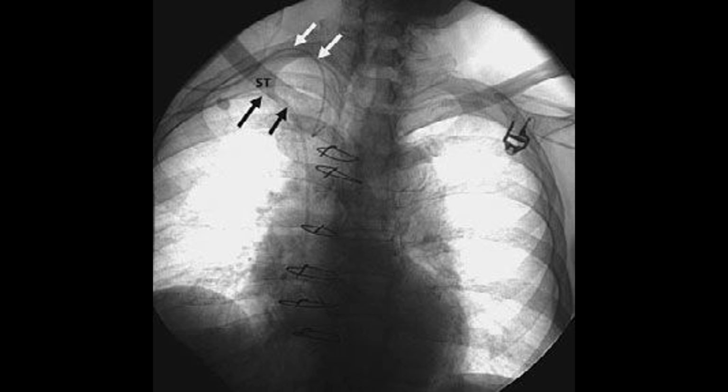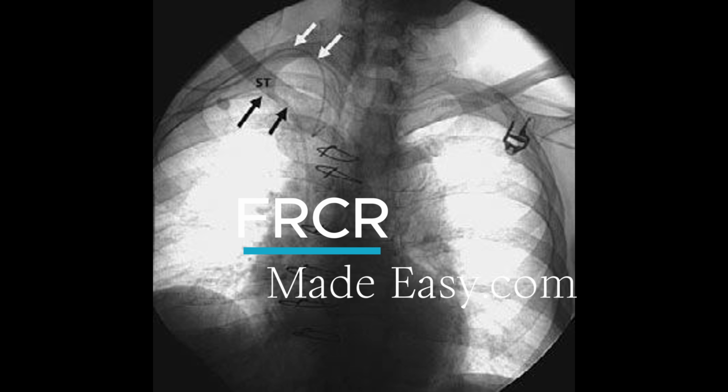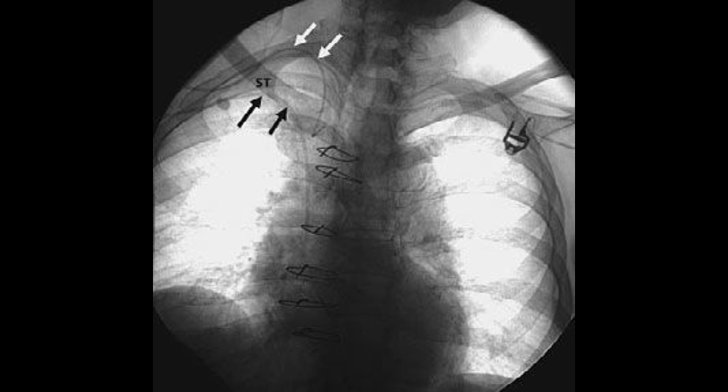In summary, this case demonstrates inadvertent intra-arterial placement of a peripherally inserted central catheter into the right subclavian artery, recognized by its abnormal posterior and superior course over the lung apex toward the aortic arch. Early identification and appropriate management are essential to prevent catastrophic vascular complications.